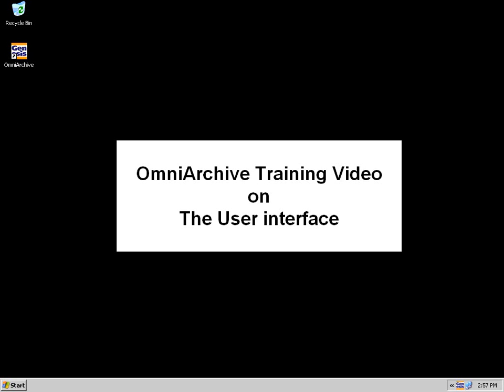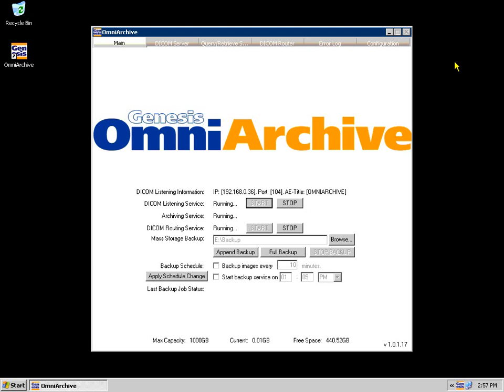This is the OmniArchive training video on the user interface. OmniArchive requires an active network connection to run. When you first turn on your computer, OmniArchive will start automatically. If you have an internet connection, OmniArchive will update automatically. Then the program will begin and you will be brought to this screen.